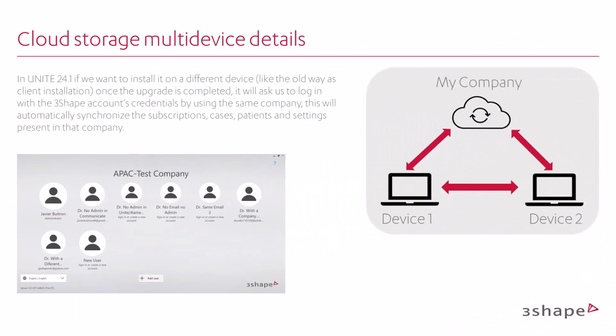In Unite 24.1, if you wish to install it on a different device, similar to the old client installation method, upon completion of the upgrade, you will be prompted to log in with the credentials of your 3Shape account associated with the same company. This action will automatically synchronize the subscriptions, cases, patients, and settings present within that company.